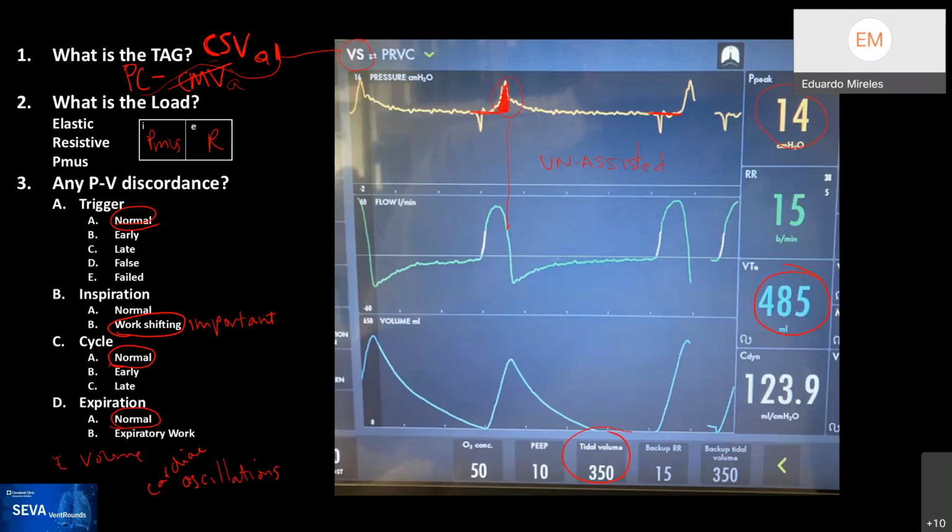Then suddenly the respiratory system stops receiving and it's rapidly changing; now it's relaxing the muscles. Because the pressure controller is not good enough, you see this pressure that rises as a manifestation. The machine is trying to drop the flow, but it can't, and you have that rise. Okay. So it's also an artifact.